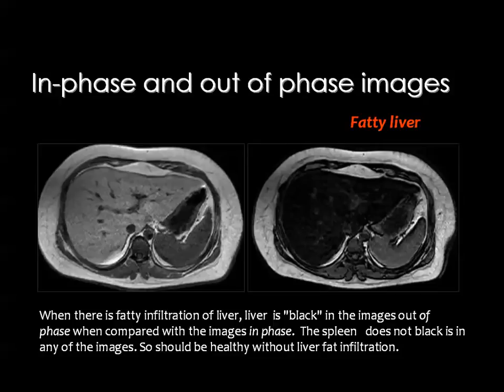If you look here, this liver is relatively bright, and the liver is usually bright in the T1 weighted image. But if you are suspecting that this is fatty liver, you should have the out of phase T1 weighted image, and if the liver is fatty, you will get this darkness in the liver parenchyma, indicative of it containing fat.